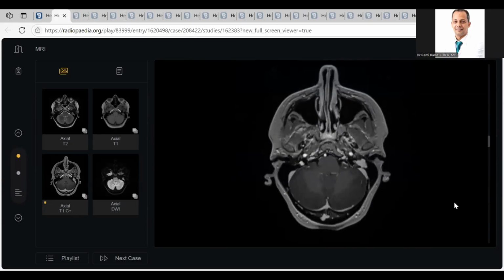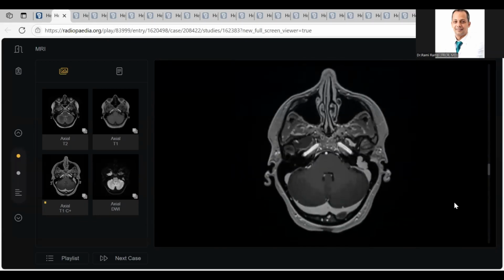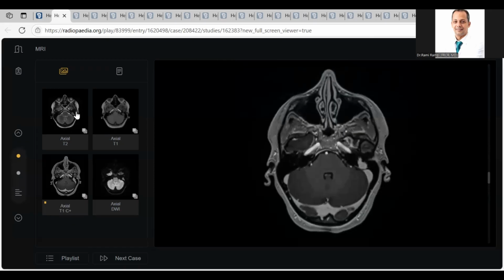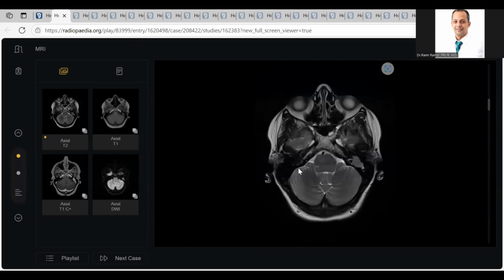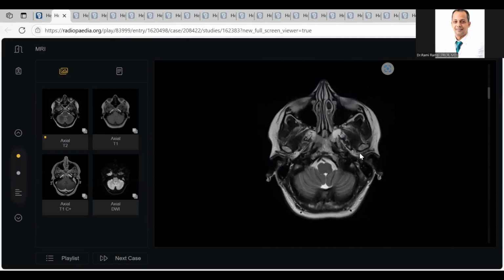So give me the last differential diagnosis, please. Last differential in the middle ear, otomastoiditis, but again less likely. Mastoiditis will show this avid enhancement. Look here. Enhancing mass lesion within the middle ear. What it could be? One is a glomus tumor.